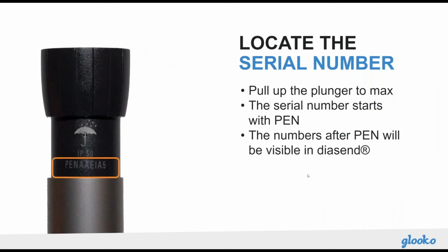Once the data is within the diasend platform, you will see that it is first assigned to the serial number of the device. To find the serial number of the smart pen, you would wind up the plunger as seen here in the visual, and you would then be able to see the serial number, which is encircled here by the orange box.